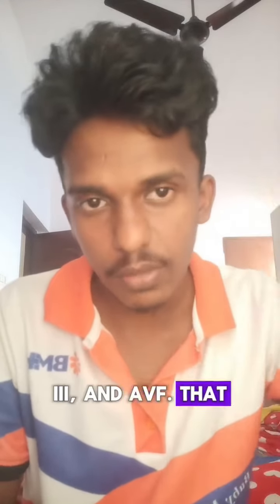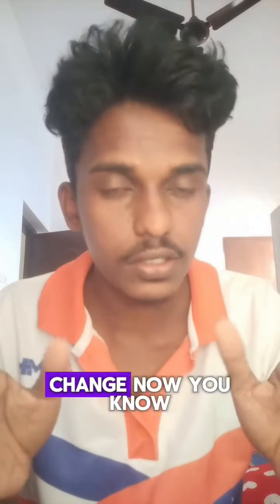2, 3 and AVF. That means the inferior leads. This is the reciprocal change. Now you know.